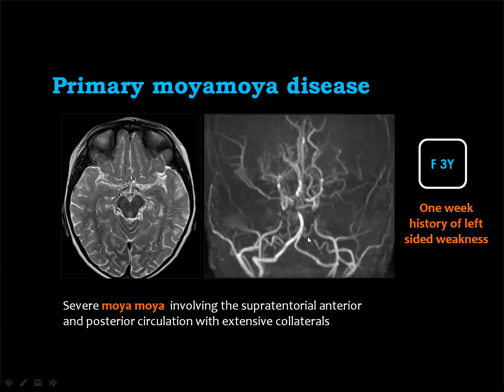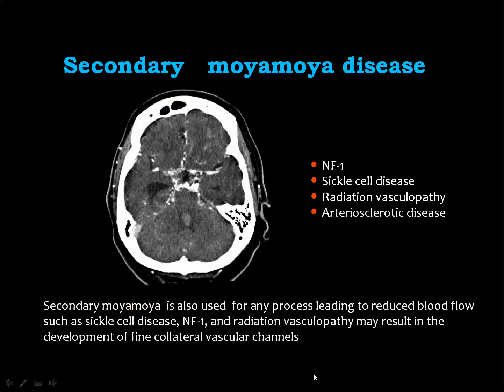And if you have an MR angiogram, of course, this is not provided in the exam until late in the exam, after you realized that you did a big mistake. Then they show you the MR angiogram and they say, okay, this is Moya-Moya disease. And okay.